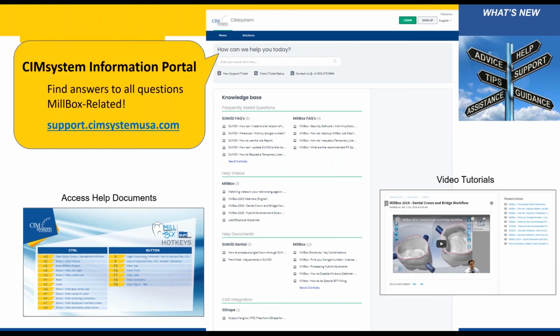That is shortcut hotkeys. So for example, the fixture is in your way and you're just kind of like, why do I need this fixture view anyways? Control and E hides the fixture. There's a way to go through the tools and to do it real quick too, but that's 2 clicks. You might as well use Control and E. It toggles it on and off.